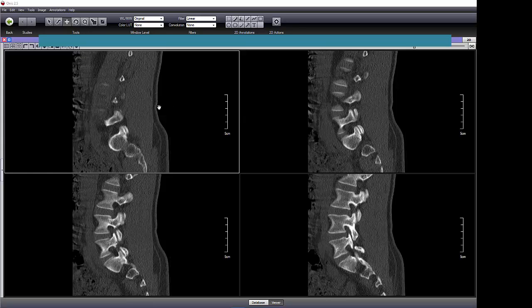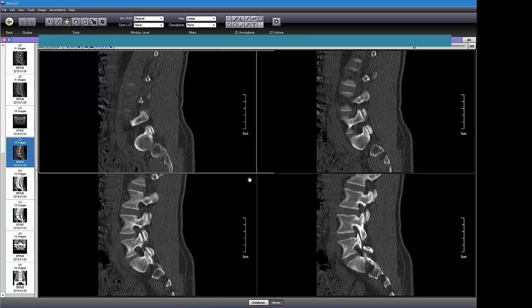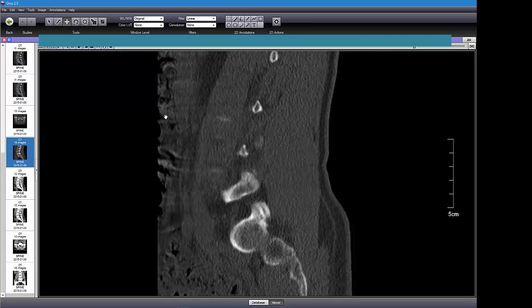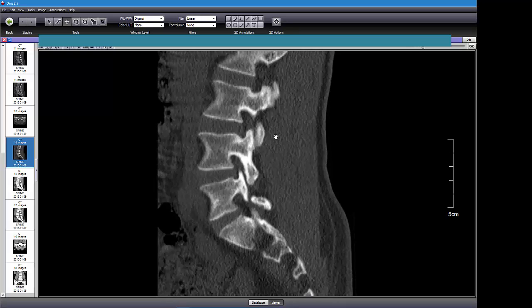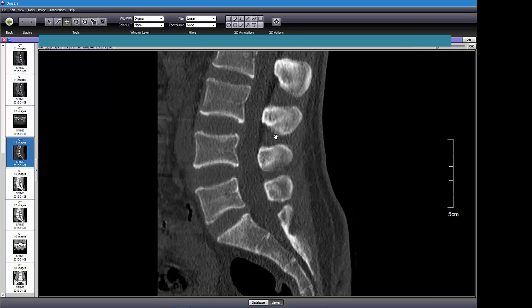And the first thing, there's 4 images. First thing you do is you open up these things. And that shows all the images. And you load up a view from the side on this side. There's 4 of them. Just double click anywhere and they turn into a single image. And then use your up and down arrow key. I don't use a mouse, but you could probably use a mouse, I'm sure. And you can pan between the different slices. Remember, this is a view from the sagittal view. Belly's out here, low back's over here.